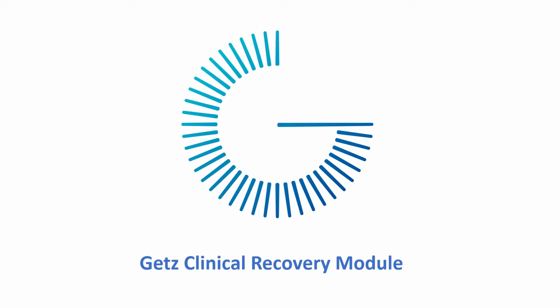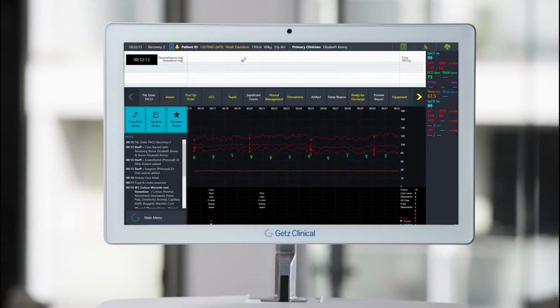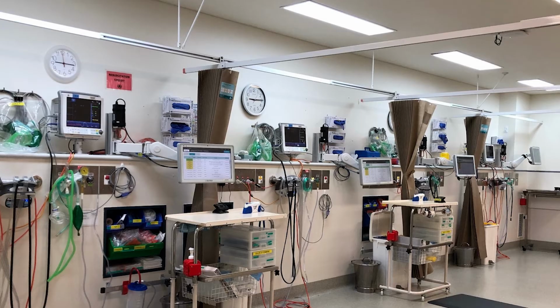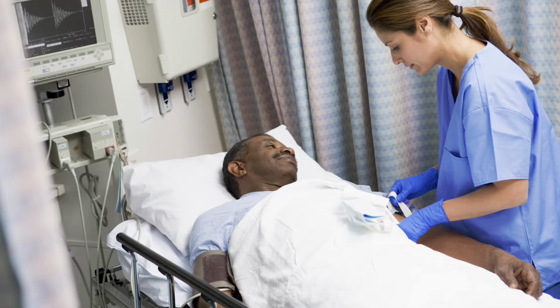The Recovery Module can also be referred to as PACU, an abbreviation for Post-Anesthesia Care Unit, depending on your preference. This module is part of the GCC perioperative suite, which captures patients' procedural information and is openly interoperable with hospital patient administration systems. The GCC Recovery Module is accessed through a purpose-built medical-grade Getz Touch device, installed in each recovery bay and connected to the patient monitor. The system allows clinicians to enter patients' recovery assessments, medications, and fluids, along with continuous real-time monitoring of patients' post-op condition from the patient monitor.